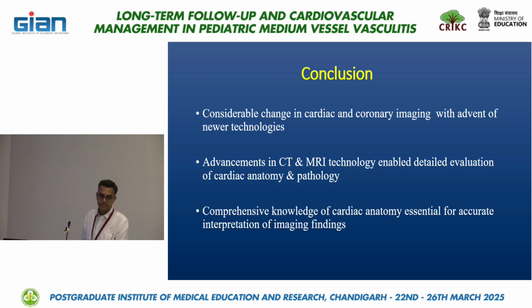How will we differentiate saccular aneurysms from pseudoaneurysms and aneurysms in these cases? No, on the basis of CT it is not possible distinctly, because it is a pathological condition, whether all the walls are there or not.